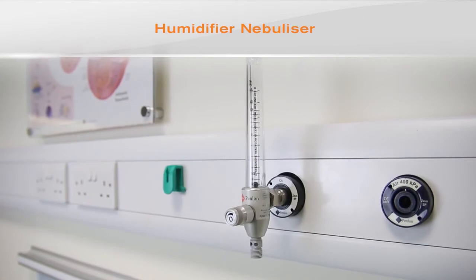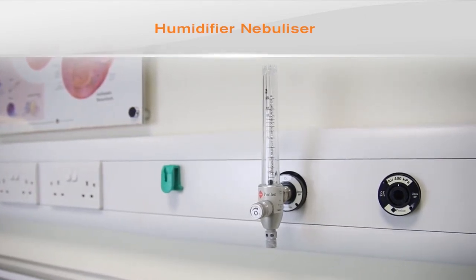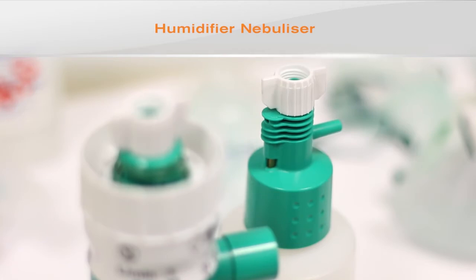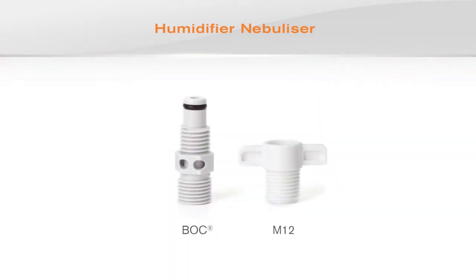There is no international standard for flow meter connections, and they can vary by country and manufacturer. The Aquaflow and Aquamist both incorporate a DISS oxygen connection, which is the most common type. Flow meter adapters are available to fit other types of flow meter, for example the M12.